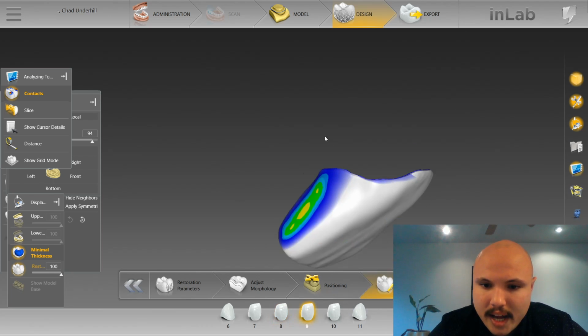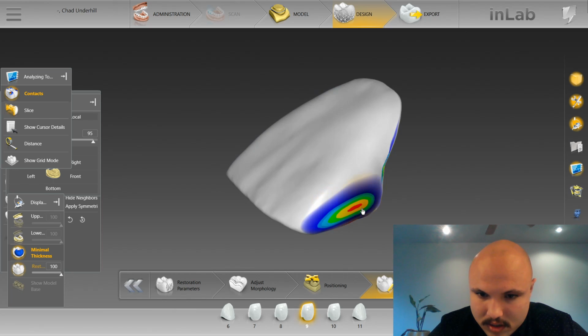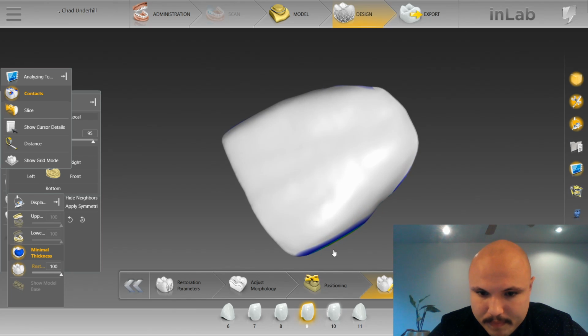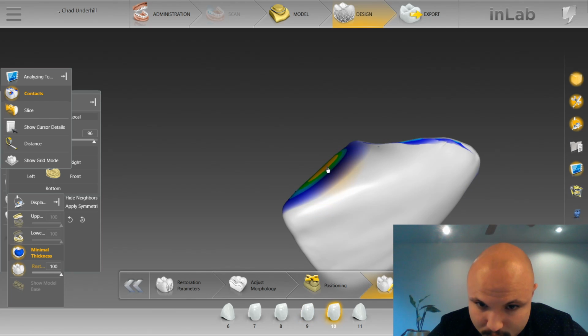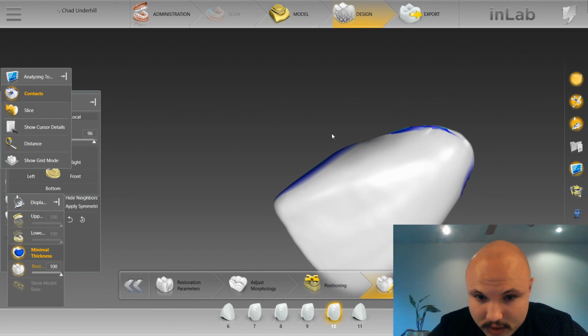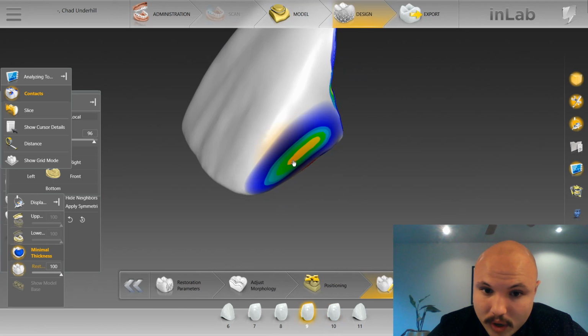We're going to do the midline last, so let's skip the midline. It doesn't look like we have much to do anyways. You don't want any of these interproximal contacts, if you look at them from this angle, to be convex or concave. You want them to be nice and vertical. That way you can seat any one of them at any time also.